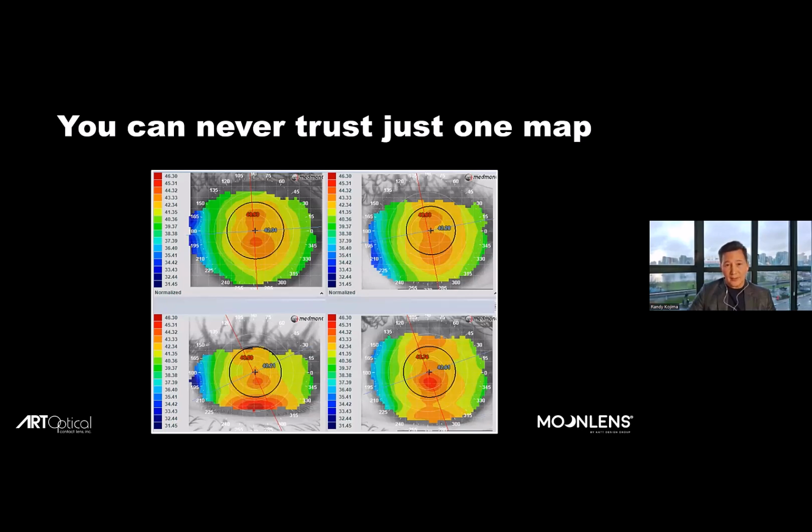eye. And this is a good example where every one of our maps looks different. This is the same eye imaged 4 times over, and there is zero reproducibility here. So that's a dead giveaway that there's a problem with the mapping. Was the patient moving around too much when you took the captures? Were you, as the user, unsteady with the instrument? Was the tear film really bad? Was the fissure size causing a hindrance to capture? Those are some of the things that you might look at.